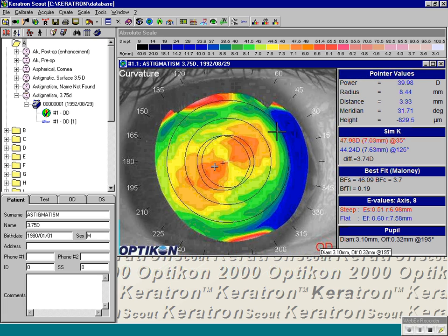The one more section for the Database Explorer is the Patient Information Report. This area is not where you enter information. This area is a report of information that has already been entered. This patient we've selected has his name and all information here. And if we click on Test, it has not been grouped.